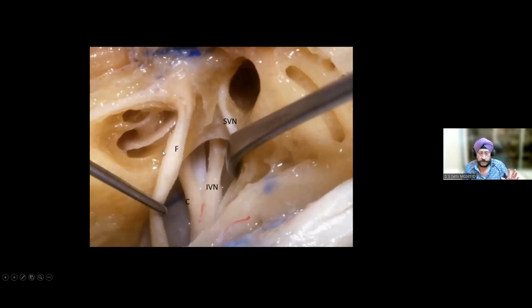I think this is Satish's favorite subject, so I'm not going to steal the thunder from him. But again, you see a beautiful relationship of the GSPN and the cochlea right here with the labyrinthine part of the facial nerve. And so let me go on to the next slide here. And right here, that may be the singular nerve, which is going into the foramen right here. And what is this? We talked about it just now. So this is the posterior semicircular canal. And if you're going to look for the endolymphatic sac, it's going to be right down there.